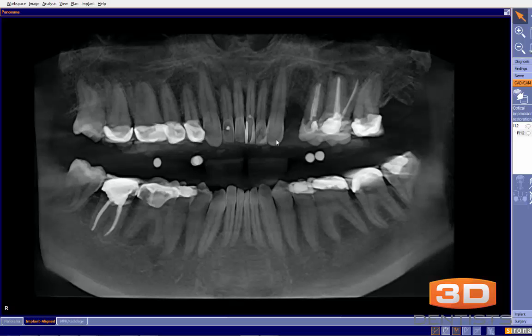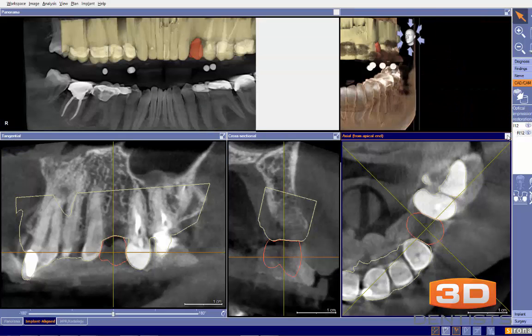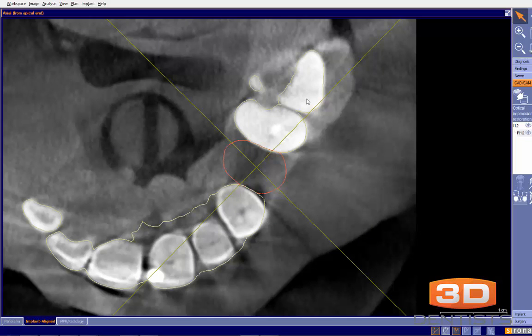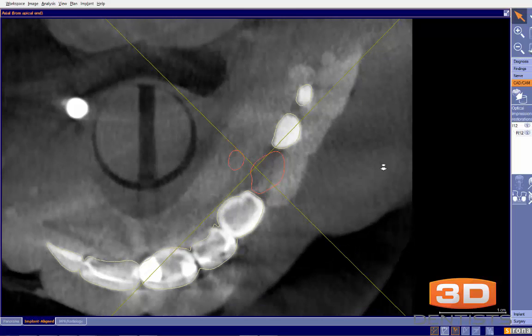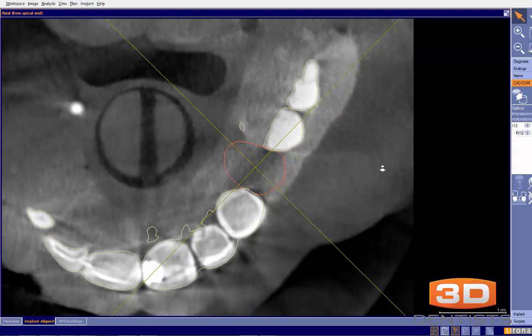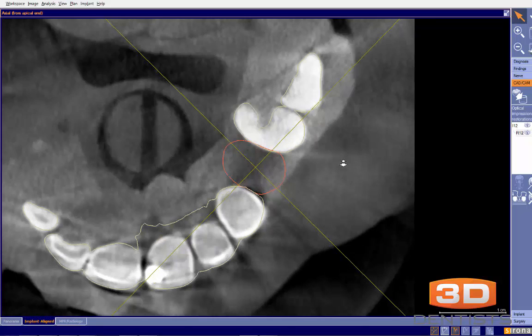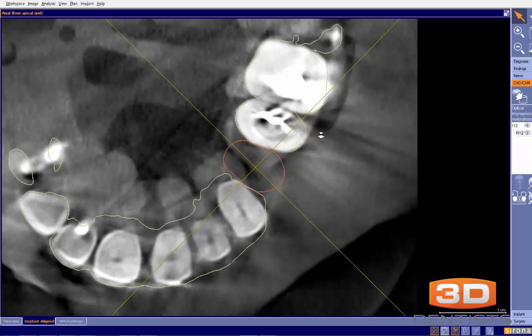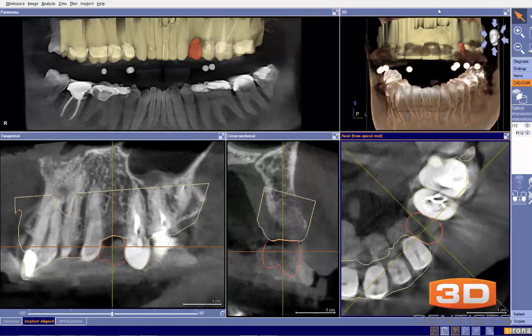data to get integrated. And also, if we take a look that you were able to integrate your CEREC data, and if we take a look at this at the axial view, you can see that our data has integrated quite nicely right here. See how closely that approximates the teeth here. So while a classic guide has been scanned for, it is a great safe bet.